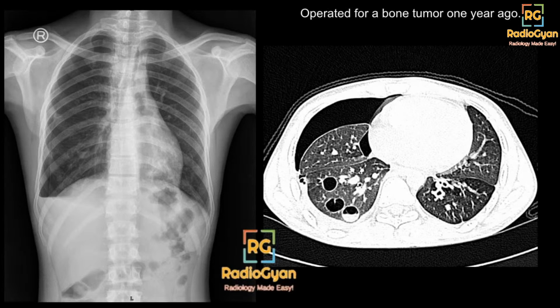Perfect. As a few of you have rightly pointed out, Ayush, Stuti, Dr. Sapna, Manish, Jyoti, perfect. What we see here is that this is a chest radiograph. The lung markings are not reaching towards the peripheral portion, and there is this subtle line. It's very difficult, especially over projected images, a single image, but I hope you can appreciate this subtle line. So there is pneumothorax, which is better demonstrated in the CT, and there are these cavitatory metastases.